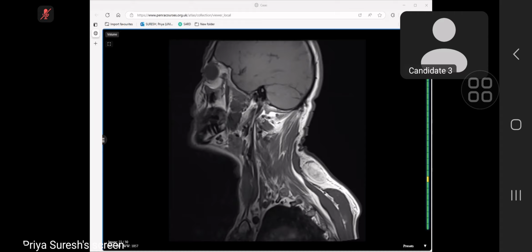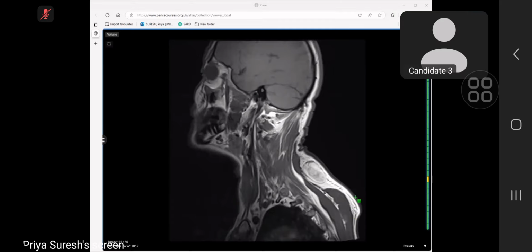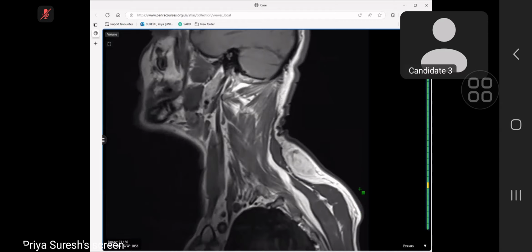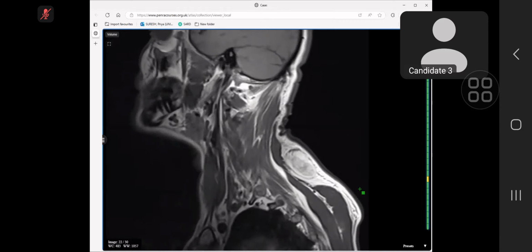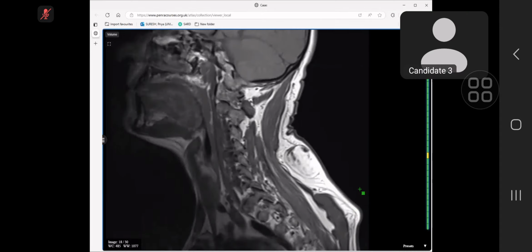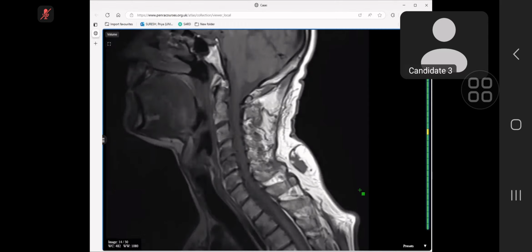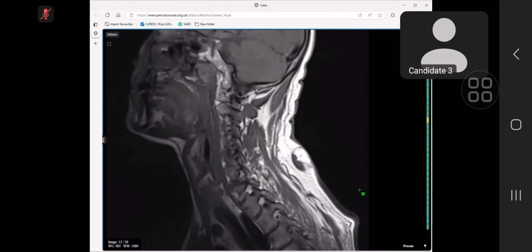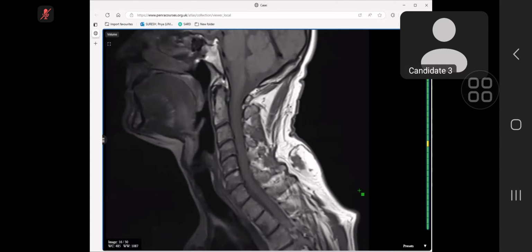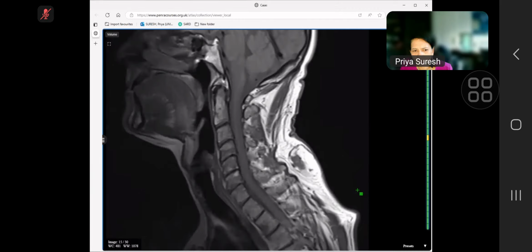I am provided with the T1 MR images of the patient in which a fat attenuation lesion is noted on the back of the neck and the lower cervical spine, which is overlying the muscles. I can see that there is mild pressure over the underlying muscles. There is no skin or subcutaneous tissue infiltration. There is differential density within the lesion as well. I would like to see this on post-contrast images to rule out any enhancement. As the lesion borders are sharp, this is likely a benign lesion.